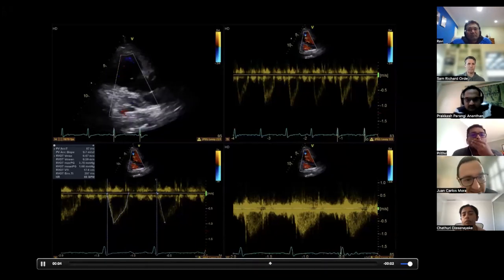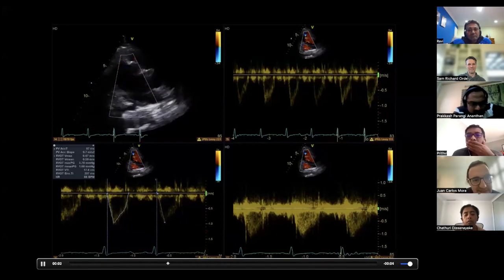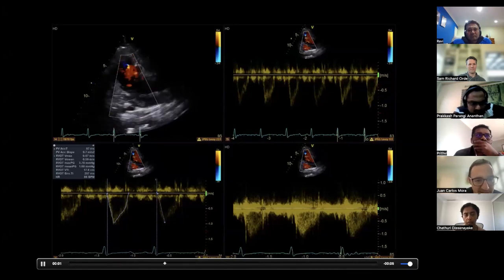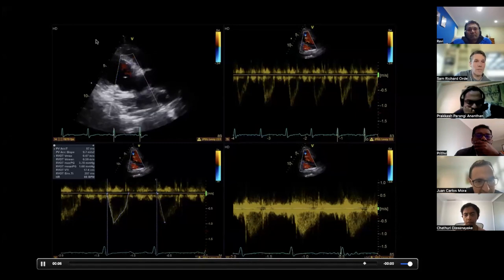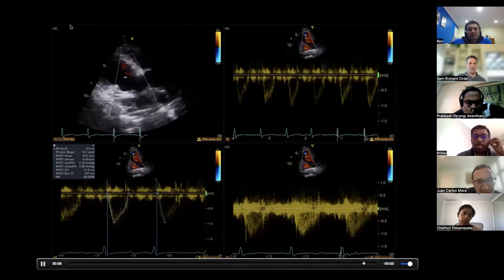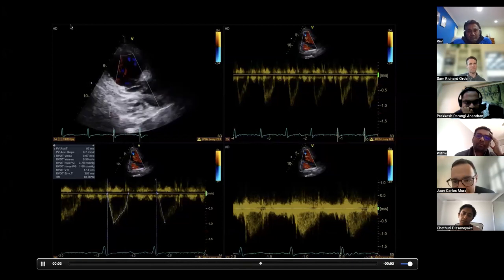It's a lot of information here. The 2D image with overlay color flow is an apical 3-chamber, and that does appear to be, so that's meant to be the pulmonary valve. So we've just got a parasternal long axis view tilted up. We've got the pulmonary valve there. Oh, okay. And these are pulmonary valve flows. Oh, that makes more sense. Okay.